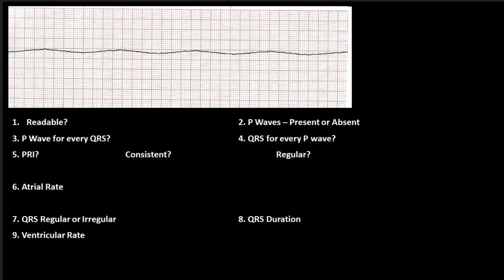Video, we're going to look at asystole. So let's start off. Is this readable? And the answer is yes. Sometimes you may have to question whether or not the EKG is even on. P waves, present or absent? There are no P waves.